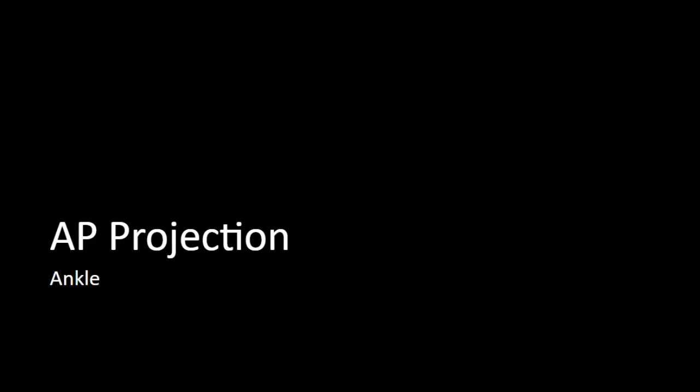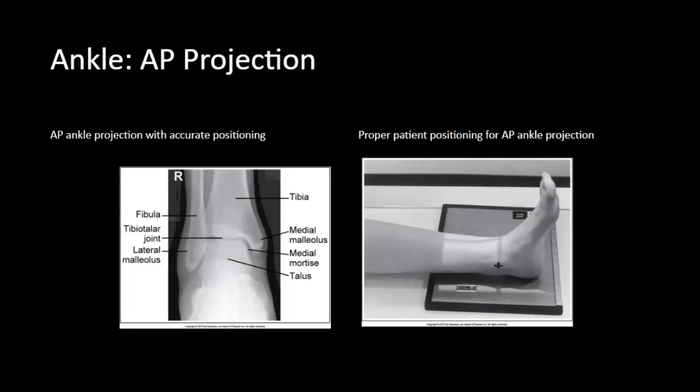Welcome to the image analysis of the ankle. Image analysis guidelines of the AP projection for the ankle state that the medial mortise should be demonstrated as open. The tibia will superimpose one half of the distal fibula. The anterior and posterior tibial margins should be demonstrated adjacent to the medial malleolus. The tibio-talar joint space is demonstrated open.